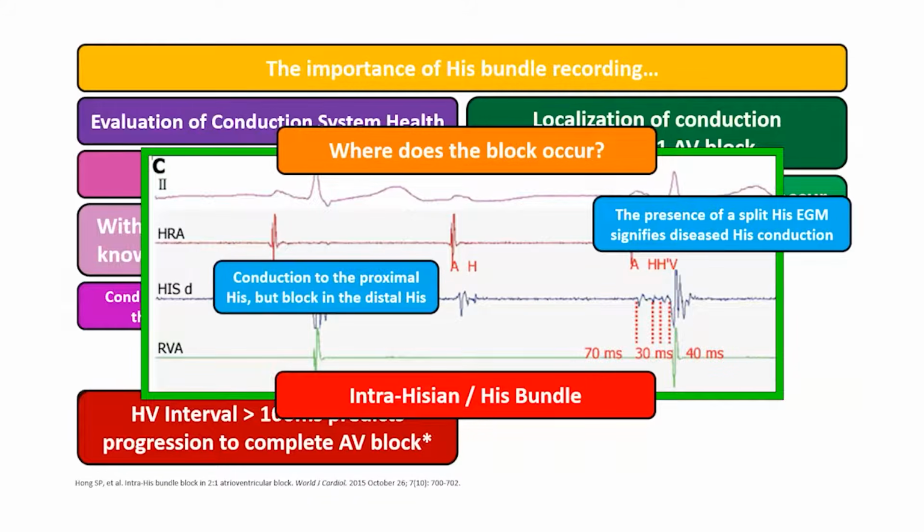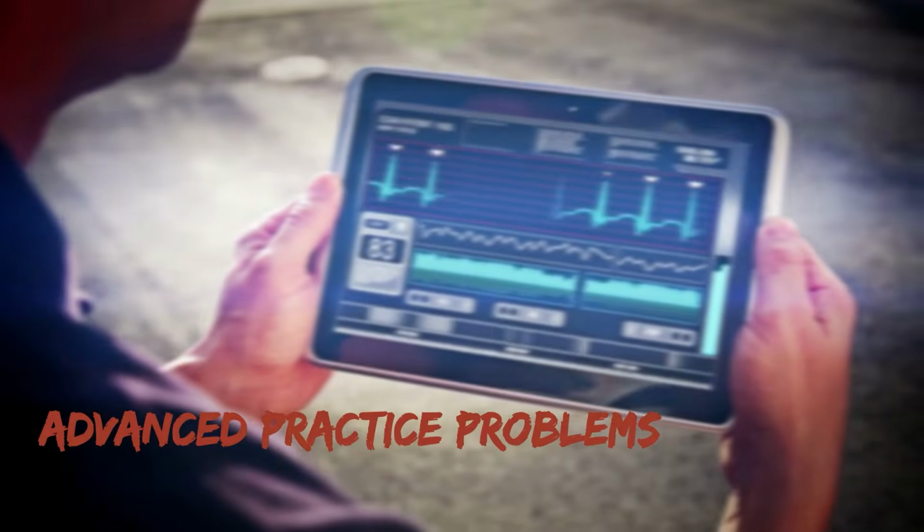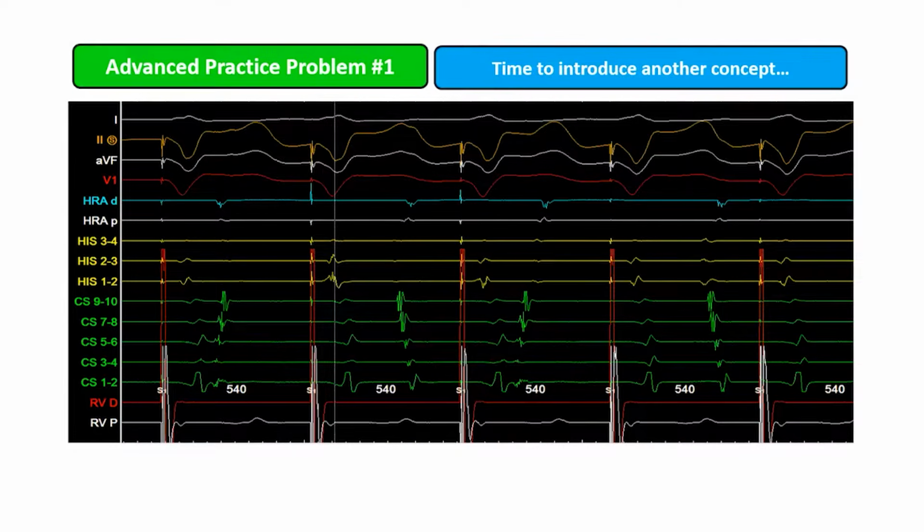It's pretty cool, right? Time to move on to more advanced practice problems. It's time to introduce another concept here, and the concept is pacing maneuvers.